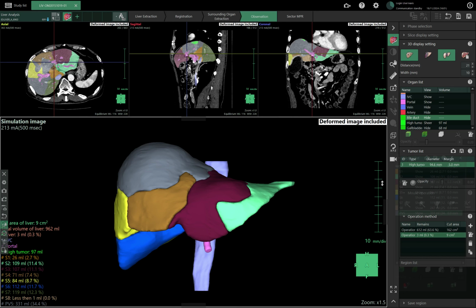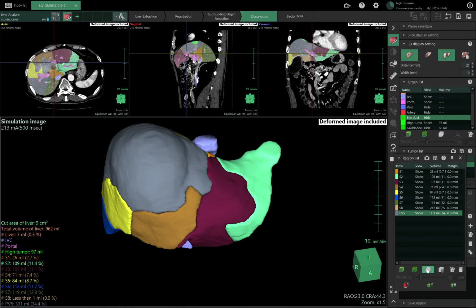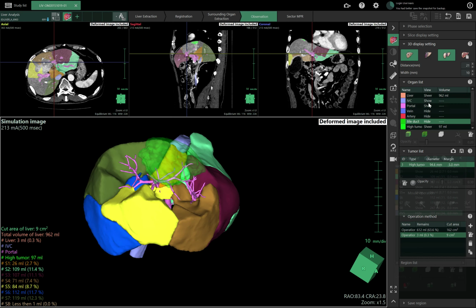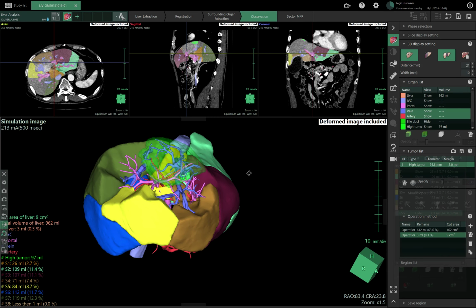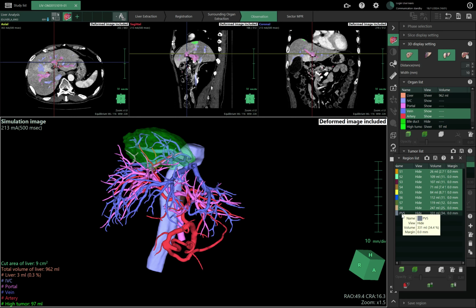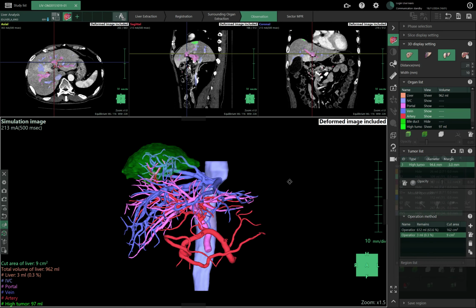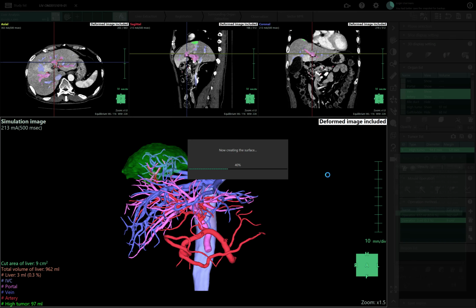And most of them tell me that they want to know exactly which vessels are inside one of these regions, and exactly what's here and where they need to cut. So this is really what they expect of this kind of application. But it has some other uses. I don't know if they are really practical, because when I have shown them to the doctors, they have been quite indifferent.